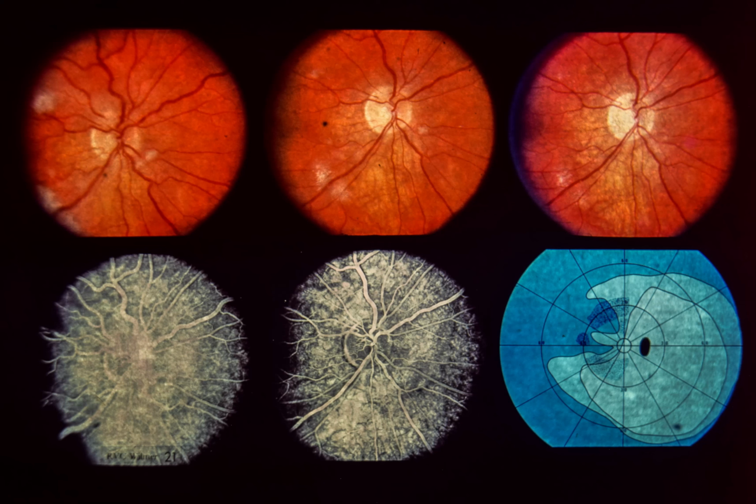Upper center. After 2 weeks of steroids, the optic disc is less hyperemic and edematous. The cotton wool spots are resolving. The inferior temporal retinal arteries show focal narrowing. Lower center. A fluorescein angiogram after 2 weeks of steroids shows that the optic disc capillaries no longer leak fluorescein. Upper right. After 6 weeks of steroids, the right optic disc is no longer edematous, but there is temporal pallor. The cotton wool spots have almost disappeared. Lower right. A nasal visual field defect corresponds to the temporal disc pallor.